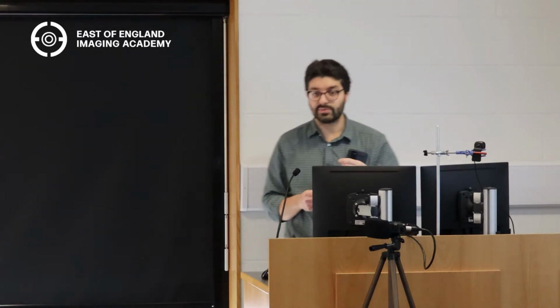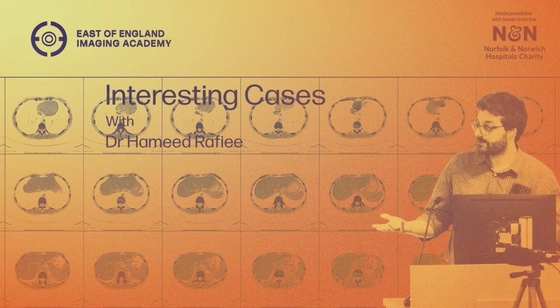So you want the arterial phase to see, is it a really brightly enhancing lesion, in which case it's a neuroendocrine tumor, or is it a hypovascular lesion on the portal phase or the arterial phase, in which case it's more likely to be an adenocarcinoma. So it can really help you to characterize lesions, because different lesions will enhance differently depending on what their blood supply is like. Does that make sense? Good, excellent. So that's a case of GI bleeding. Let's move on and look at something else.